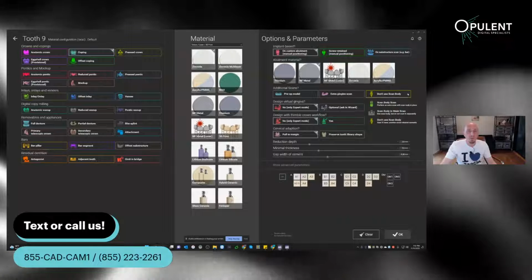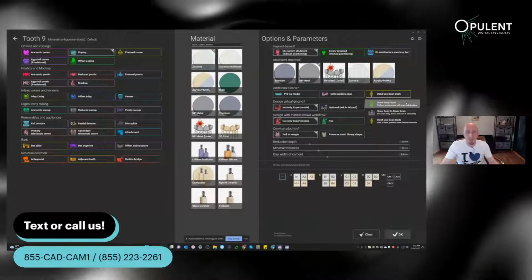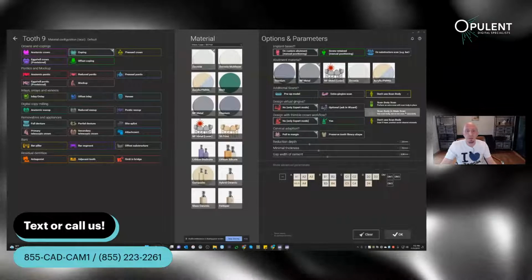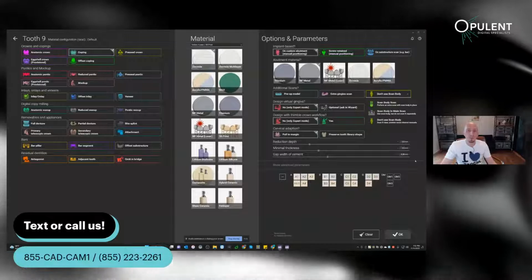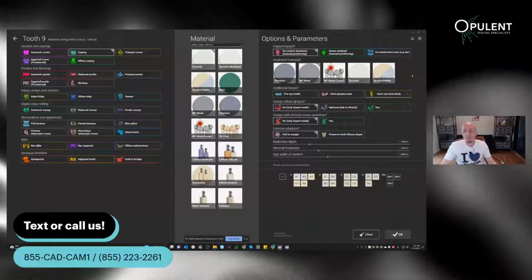And you can further down here select scan body scan if you have that, scan body in main scan, so that Exocad would then automatically subtract the scan marker, the scan body from your scan data. Or if you say don't use scan body, which is the selection here, you're doing that manual positioning.